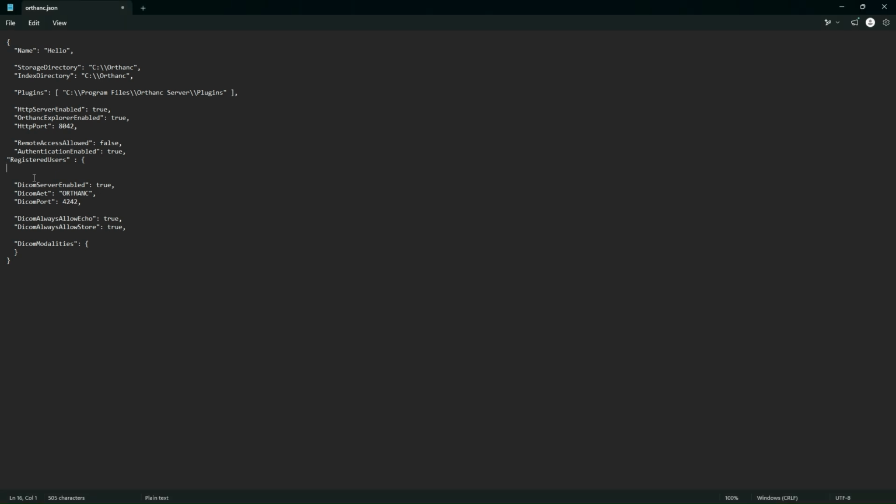How are we going to do this? Let's add a user admin. So let's put the username admin in quotes, close quotes, space, colon, space, and then we are going to put in the password. Again, our password is going to be text, so we're going to put it in quotations out there, and let's make it admin as well. So we're going to close this up.